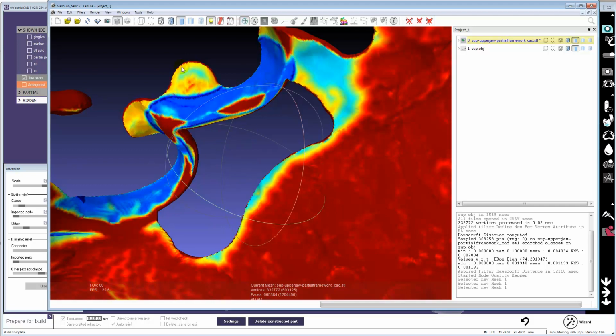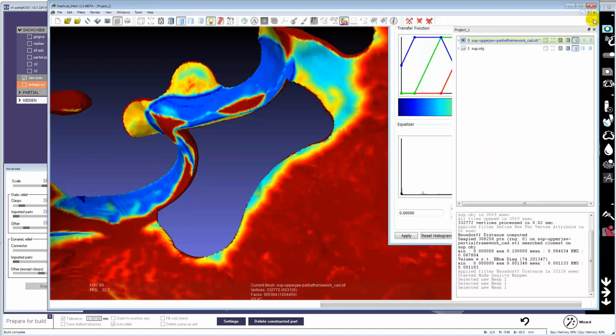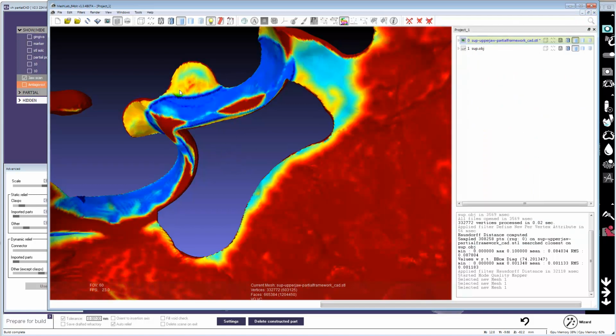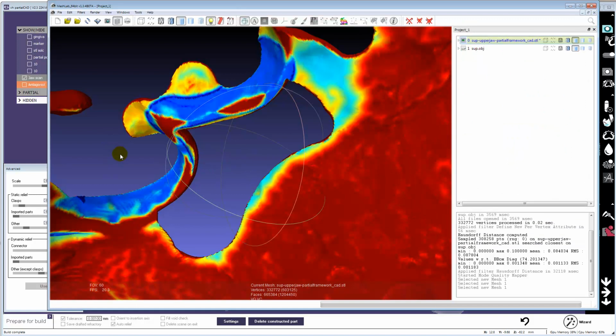The issue is that the clasp rests have a pretty significant offset. They're orange, which puts them around 60 microns, and that's way too much. They should be part of the clasp, and that's actually a shortcoming of the software. With this version, because these are free-formed in, it's not recognizing them as part of the clasp. I currently have a bunch of fixes for that which will be in a future release, but that's still in progress.